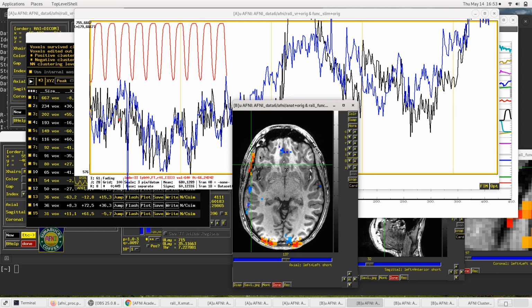So now, again, note that we haven't blurred this data. What happens if we blur this? Well, we may mask it or not with the blurring operation, but this could bleed into the brain fairly easily if you're not pretty precise on how the blurring works. And let's assume this is a muscular activation.